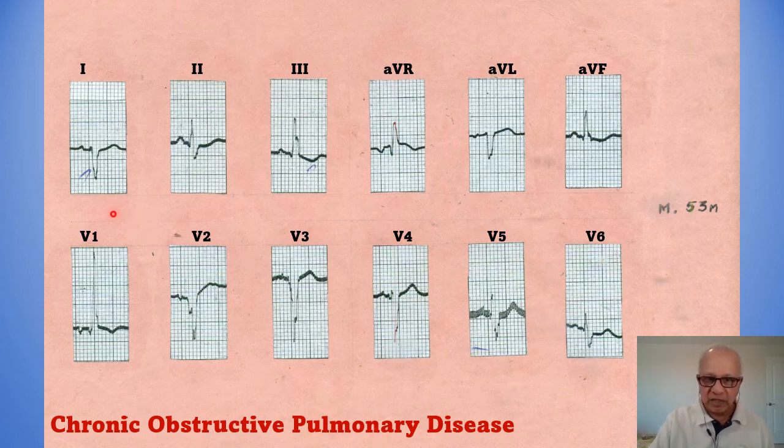Now this also is not as simple as the previous one. If you look carefully, what is the QRS axis? You have this simple thumb rule, which I told you. Lead 1 is negative and lead 3 is positive. So according to your thumb rule, when you hold your hands like this, your lead 3 shows the positivity, isn't it? So according to the thumb rule, the QRS axis is to the right.